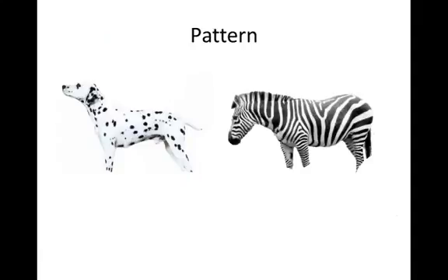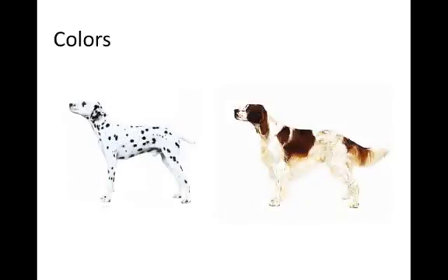Here this, of course, is chaotic. Chaotic in terms of patterns, reticular lines and structureless, and in terms of colors. Structureless in the center, reticular lines at the periphery, but symmetrically arranged. This is a symmetric arrangement of two patterns, structureless in the center and reticular lines at the periphery. It's also a symmetric arrangement with regard to color, dark brown or black in the center and light brown at the periphery. So now we have described lesions according to their pattern and their colors.